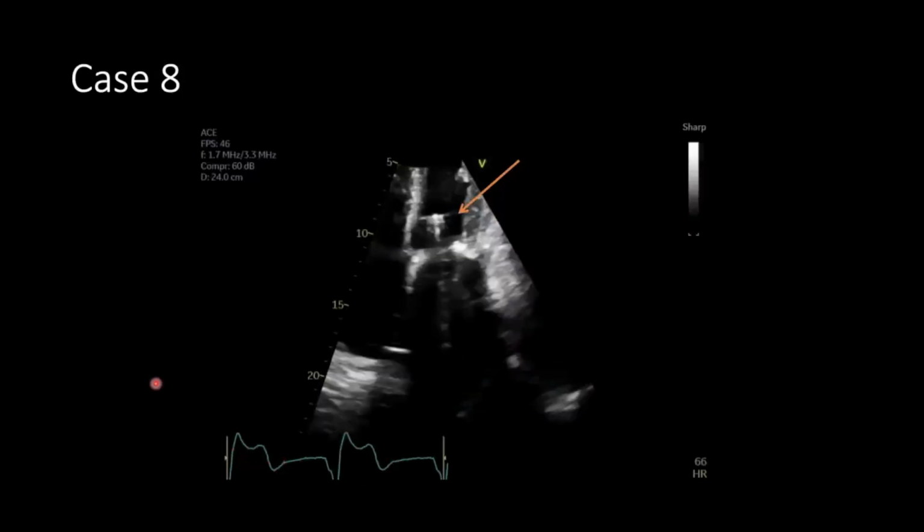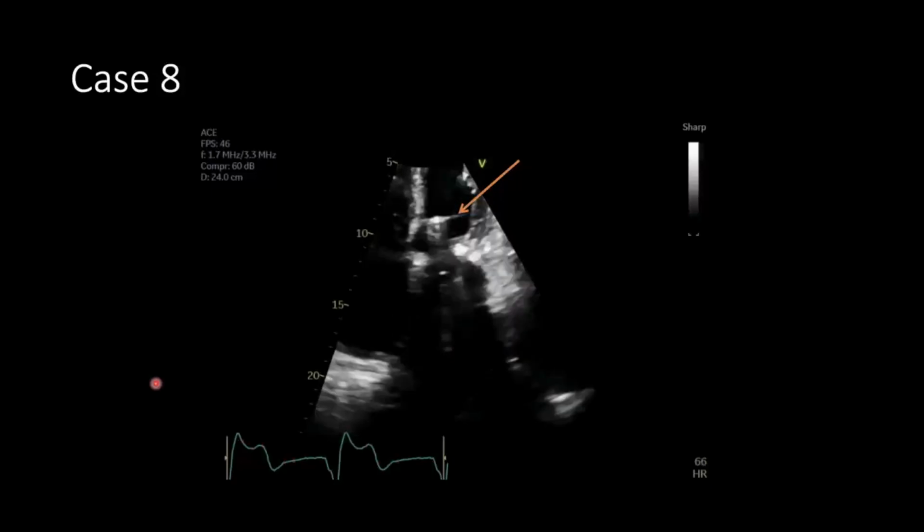Is it playing again? Okay, so this is just to give you a little bit more of a zoomed in view of what I'm interested in here. This one, I'll admit, is a bit challenging because you would want to have multiple views here, and it may not project the best on people's phones or on the screen here. But we're going to work through it a little bit.